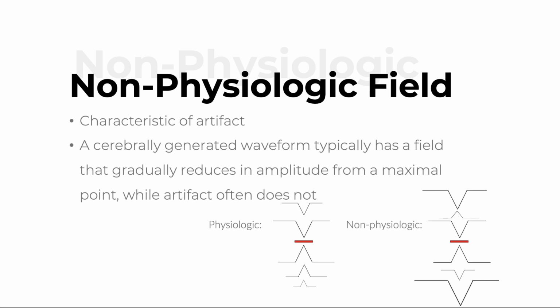When we talk about a non-physiologic field, what we are talking about is a field that doesn't really make logical sense. So we talked about how epileptiform abnormalities typically create an area with a lower electrical field in the region of interest, a negative electrical field, which then is going to create a negative phase reversal. And when you look at a standard montage, you should see this played out as here, where each electrode is compared initially to this sink in the middle that is negative.